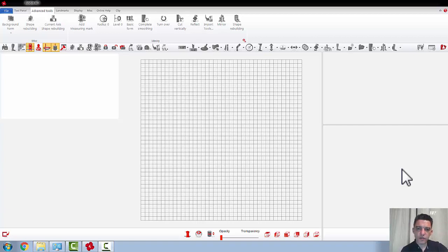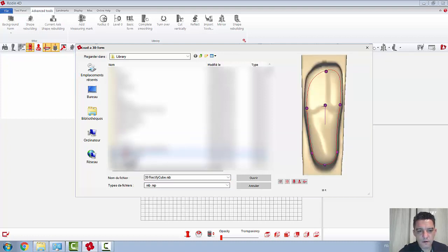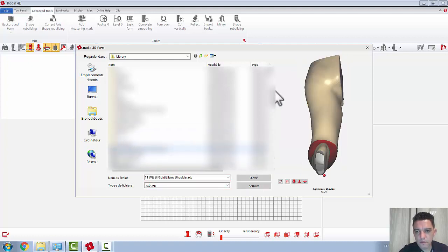It's the same as I was using in AFO and KFO, but shorter. But imagine a trick to create an axis very fast. You can open one shape, it's the same. For example, I don't know, this one, no, this one, no. This is a curve axis.